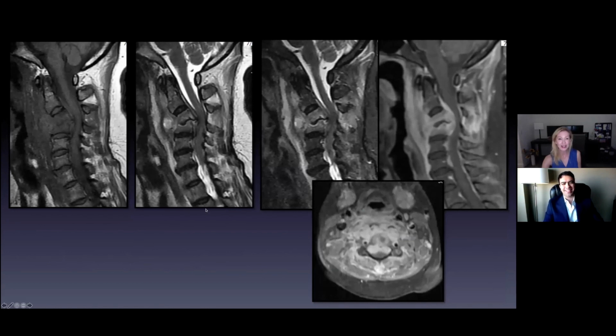So this was that same patient's MRI, and I'll just go through it quickly. Dr. Rasouli already said he was going to do surgery no matter what. This wouldn't make a difference, and I think that's because we had the contrast-enhanced CT, which showed us the most important parts. So this is the sagittal T1. We've lost our normal vertebral body marrow signal here. We've lost our disc here. Again, I won't go into too much detail since you're not doing radiology yet, probably.